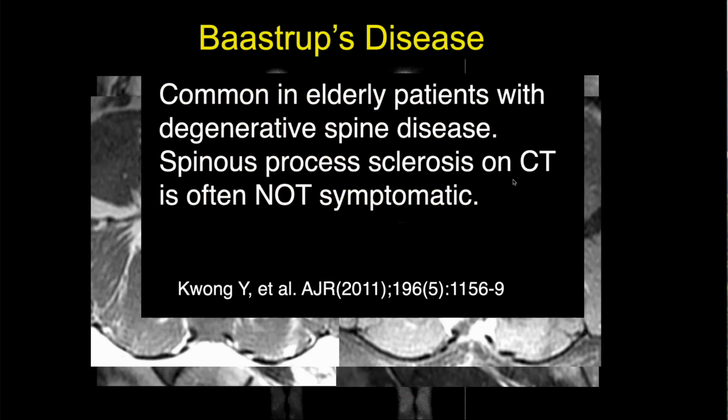Just remember that when we see sclerosis, most of the time it's not symptomatic. Edema, on the other hand, is more likely to be symptomatic.